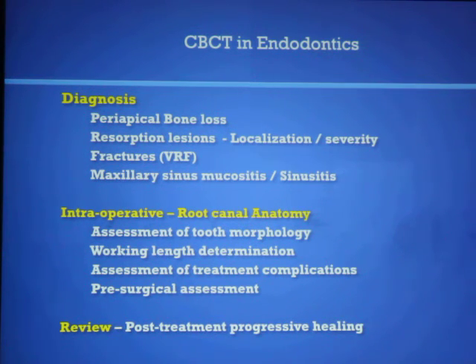So next we are looking at the use of this cone beam CT scanning in different applications of endodontics. It's for diagnosis, for the intraoperative procedures, and the reviews, and we'll look at each situation with examples.